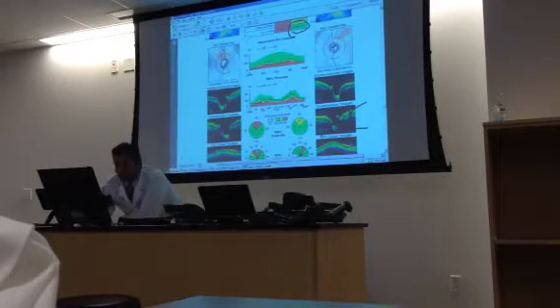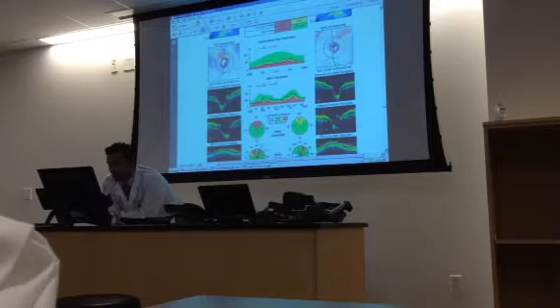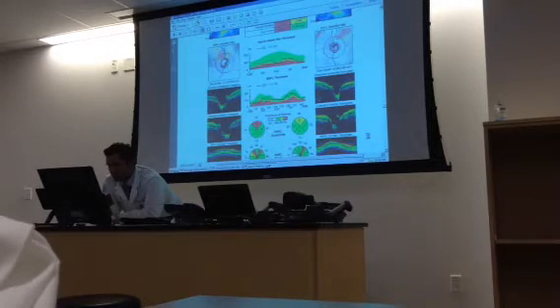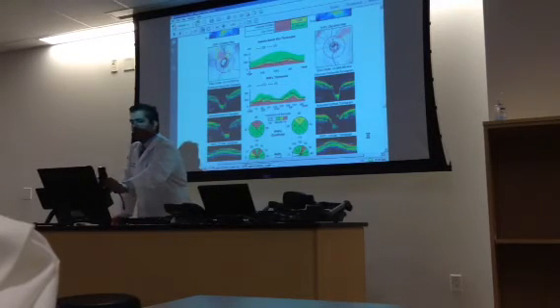The rest is color-coded, so it gives you an idea of what is abnormal, what is normal, and it should be quite easy for you to analyze. So go ahead and do interpretation report of one OCT.